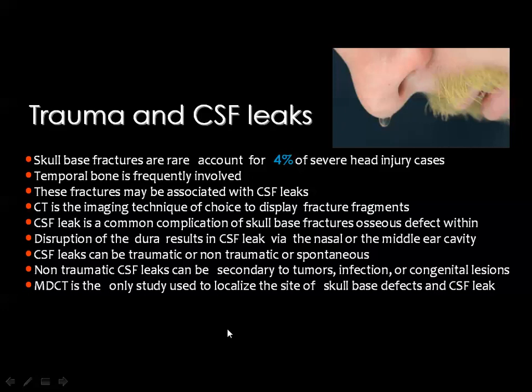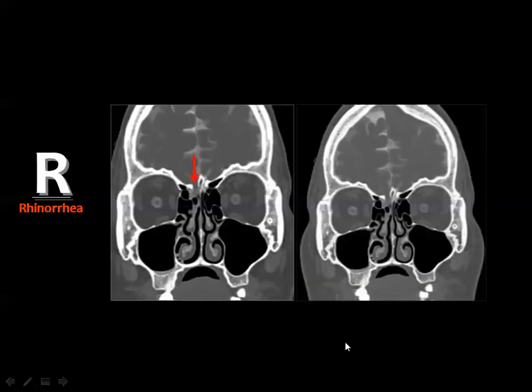And we used to use CT after injection of intrathecal contrast material to help in detection of the site of leak. But nowadays we may use the true coronal MRI of T2 weighted image of the paranasal sinuses in order to elicit this CSF leak.